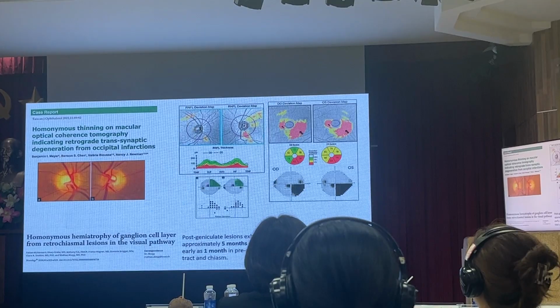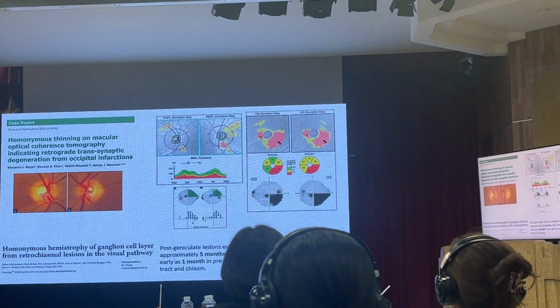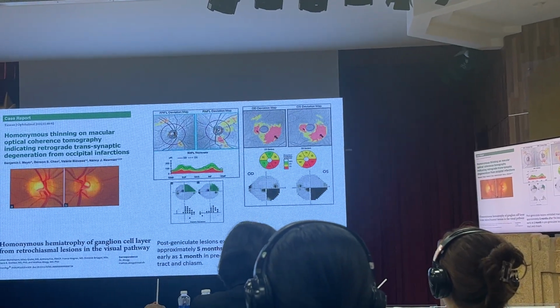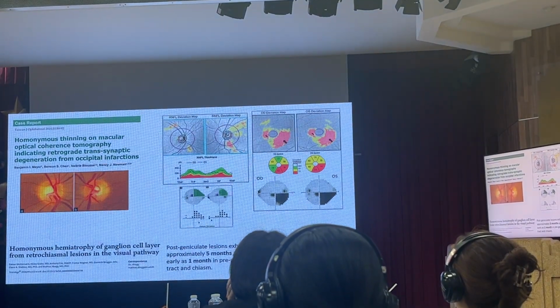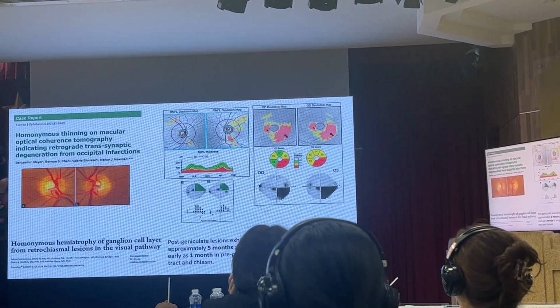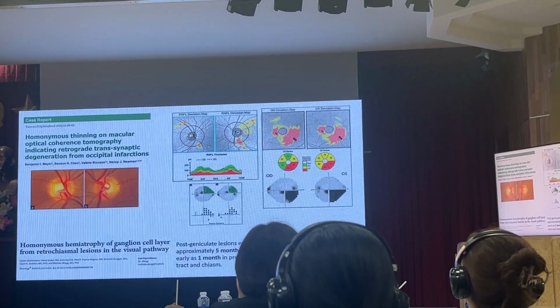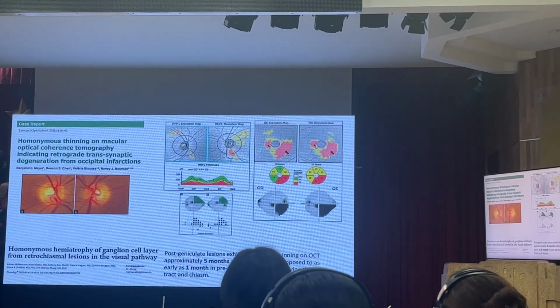You have to recall the patient again and again in order to show this loss of ganglion cells, which should then correlate with the visual field defects which are apparent from the beginning. First the visual field defect, later on the ganglion cell loss, and if you have descending atrophy coming from the brain side, it lasts about 5 months.